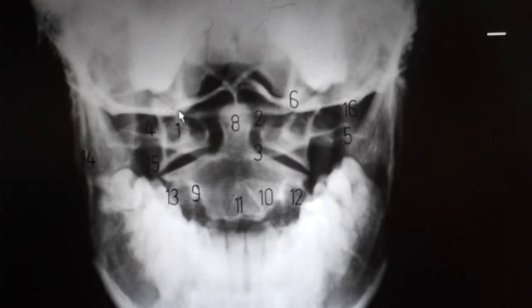Okay, that would be the occipital atlantal joint, whereas right here between C1 and C2, this space would be your atlantoaxial joint. That is the space between the C1 lateral mass and the top of C2. So that was number 6. Number 7 is out here in this dark area, and it's labeling the mastoid process. It doesn't really show up very well on this film.